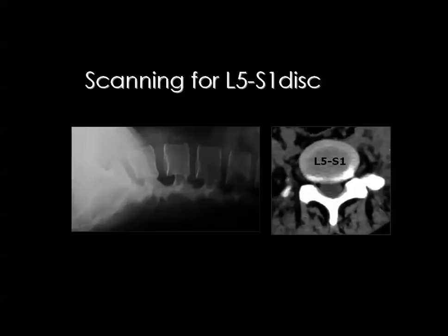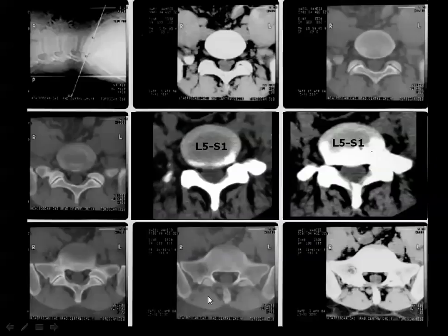Then we come to the L5S1 disc. You know that the L5S1 disc is carrying the body weight until it is divided into two halves on the sacroiliac joints. Then this disc is suffering every time, and it's allowed for the L5S1 posterior border to be convex like this, and you consider L5S1 normal at that time. Then how can you discriminate between the normal and abnormal disc at the L5S1 level? It's an easy process. Just look at the L5S1 disc and you see that its posterior border is convex.